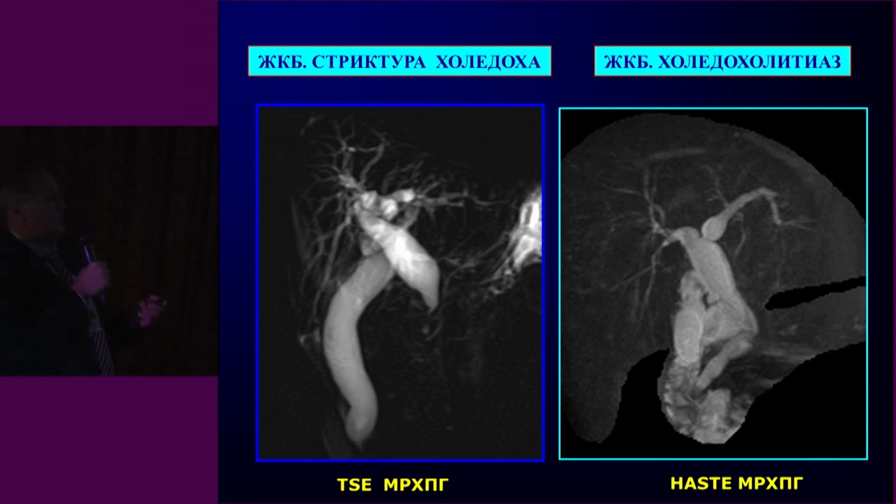But a biliary hypertension lesson could be started here, because the reason for the biliary hypertension here is CBD stricture. You can see clear-cut hypertension, and look at the gallbladder. It goes down almost to the small pelvis. Which method could obtain an image of the patient so clearly? None, except for MRI or MR cholangiography.